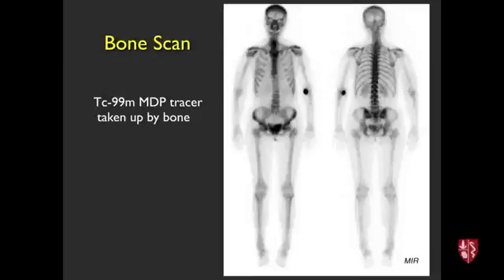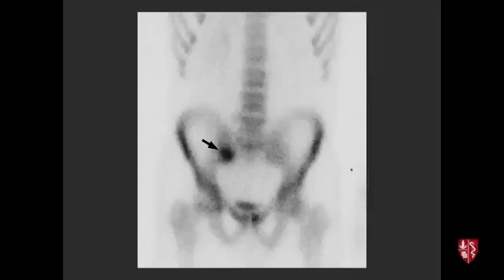And you can faintly see this patient's kidneys. Here's the urinary bladder here. This blob here on the arm, that's where the injection was done into the antecubital region, and it's almost inevitable that you get a little tiny bit of the tracer right outside the vein. So that's a normal bone scan. This one is not normal. And so here's a lower portion of the abdomen and pelvis, and there's increased tracer activity here. This would be the right side.